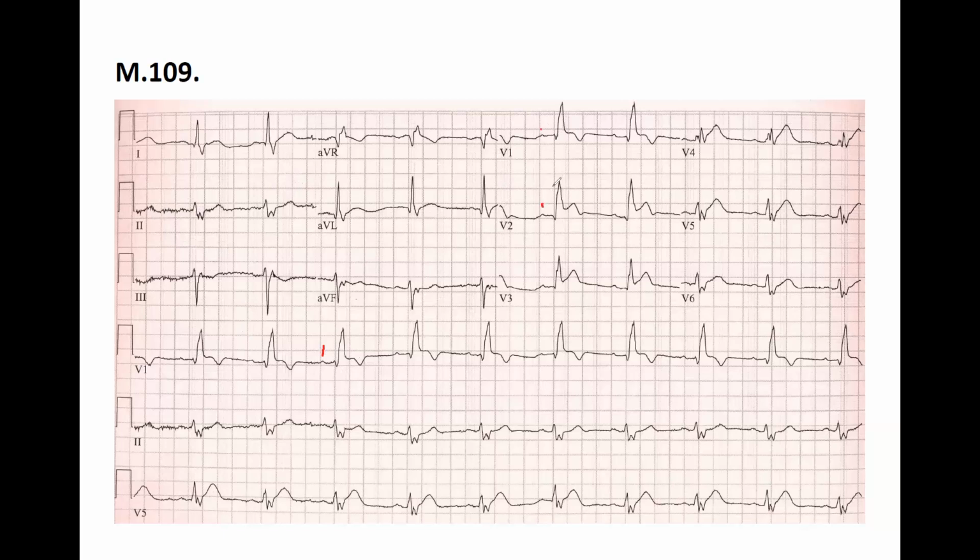First of all, this is rhythmic, so I assume it has to be a sinus rhythm. The PR interval, because the morphology is small, is hard to see, but it's normal. This is what I drew, it's 0.2, because this is the beginning of the QRS, and this is the beginning of the P wave. So the PR interval is normal.